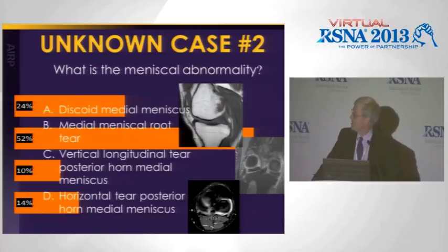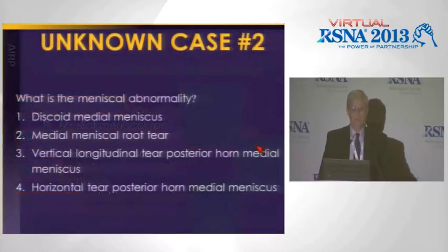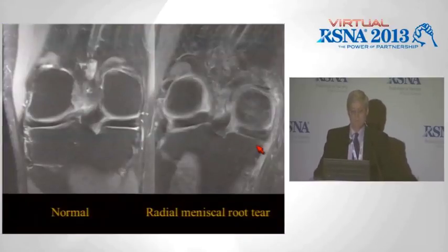And the right answer here is that this is a medial meniscal root tear. And this is an important tear not to miss, and we'll talk about that as well. So if we talk about this case, again, this is the right answer. This is a medial meniscal root tear.